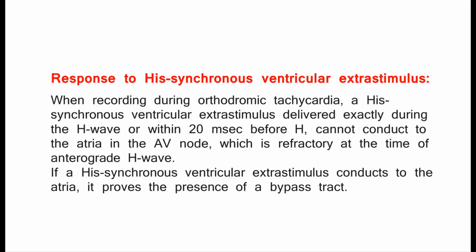Response to His-synchronous ventricular extrastimulus. When recording during orthodromic tachycardia, a His-synchronous ventricular extrastimulus delivered exactly during the H wave or within 20 milliseconds before H, cannot conduct to the atria in the AV node, which is refractory at the time of anterograde H wave. If a His-synchronous ventricular extrastimulus conducts to the atria, it proves the presence of a bypass tract.